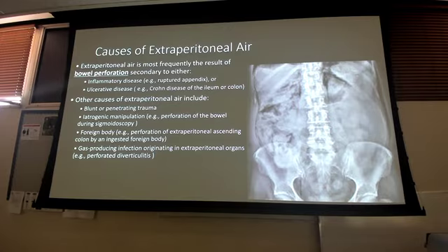Look at all of this air, and look at how it doesn't look like it's within a bowel, right? Like everything else we've looked at in the abdomen that's had the air, you can kind of make out an ovalish, circulish, tubular kind of shape that air is in. This just looks like it's kind of scattered throughout, right? Just kind of scattered throughout the abdomen.